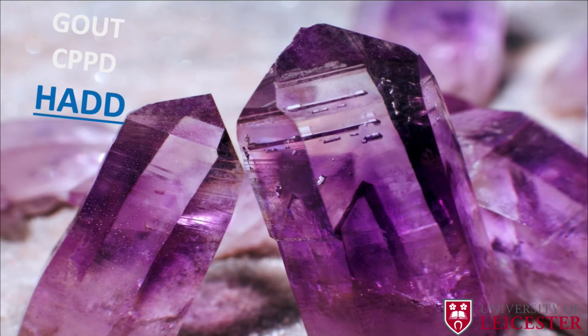Okay, so we're going to move on to the third crystal deposition disease that makes interesting findings on radiographs, and that's HADD. So that's hydroxyapatite deposition disease. And unlike the other two, you want to think about this in young patients who are quite active, and this is an intratendinous deposition disease.